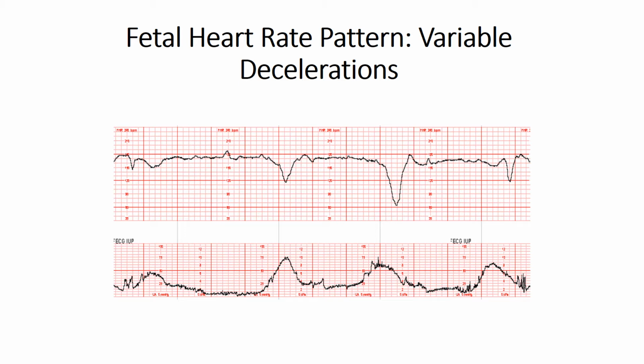You can see the variability, or the range, isn't in the fetal heart rate. It is higher than 110. Looks like we have some fetal tachycardia here. In between contractions, you can see that rate is around 170 to 175. So that's kind of high. We don't want it above 160.